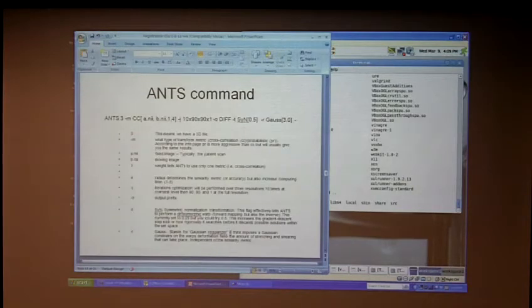And the last parameter that I have here is the Gaussian regularizer, and that just basically imposes a Gaussian constraint on the warp's deformation field. So if you think of it as like Saran wrap, right? And you're going to sort of punch through and stretch the Saran wrap. This value is basically imposing certain weights on how far you can stretch and shear that element of the warp. Okay.